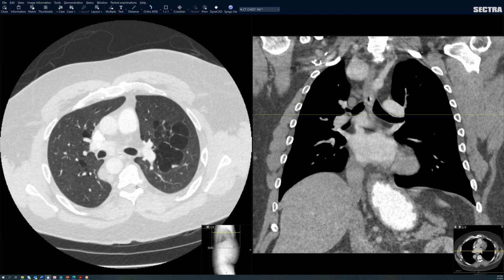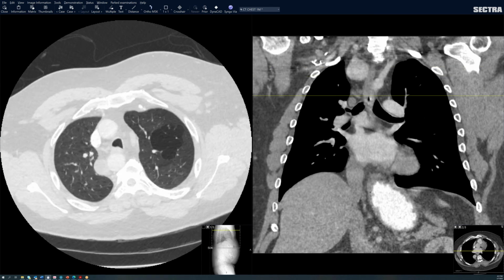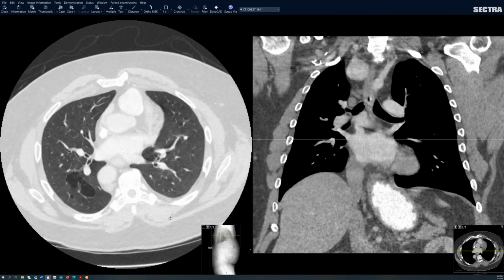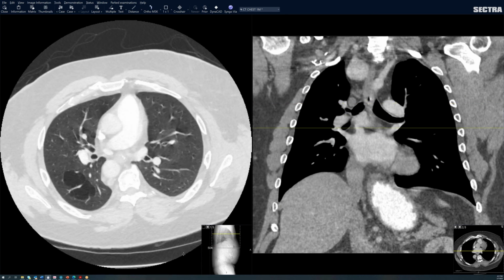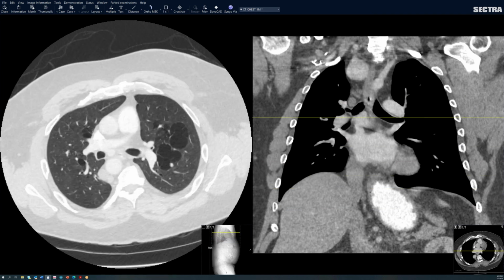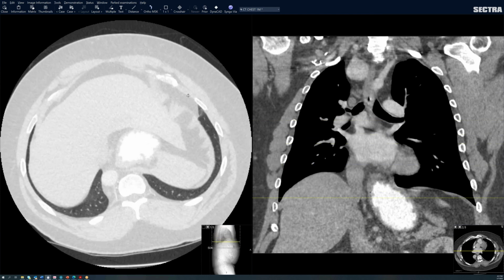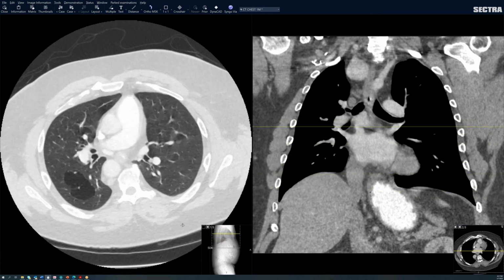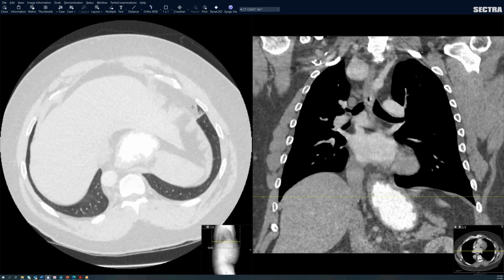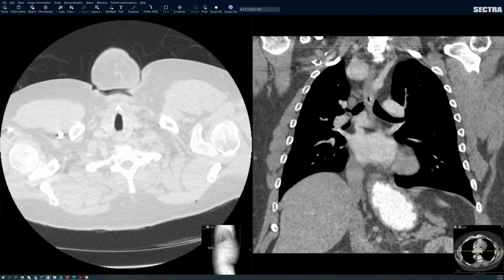Now, if you look at the lungs, I'm curious to see if anybody has any ideas. I thought this was a very interesting and intriguing case. A middle-aged person, in their 40s or something. This doesn't look like emphysema, it has very central perihilar cystic changes. Like I said, it doesn't look like emphysema, and the question was, could it be some kind of an early insult, very early in life? So maybe some BPD-related change or some kind of infection that happened early in life that led to these kind of changes.